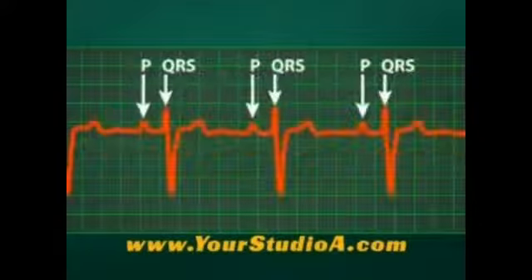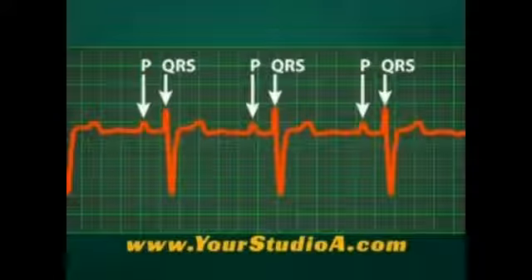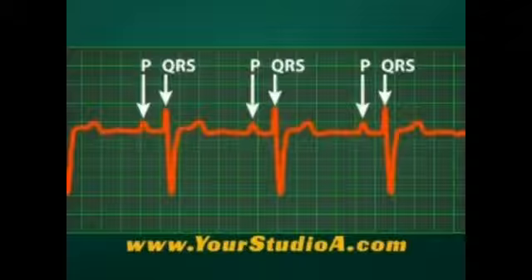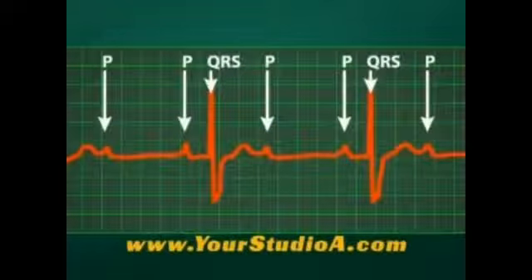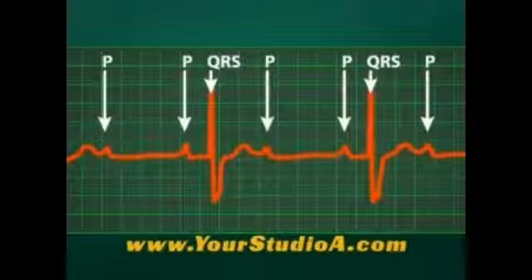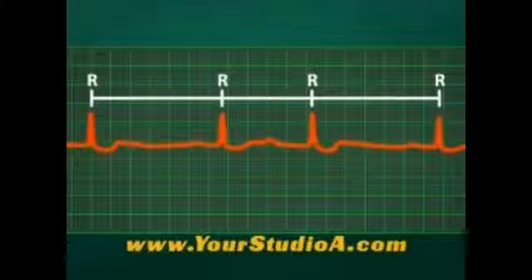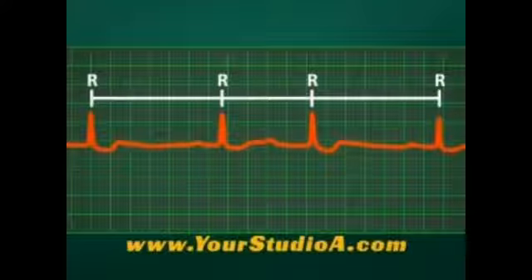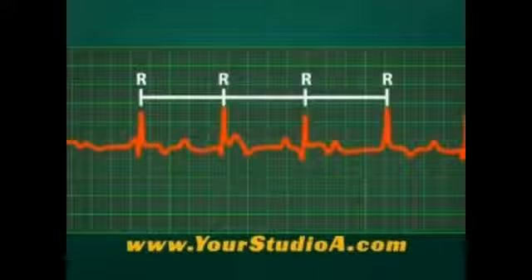If the PR interval is constant, now look at the P to QRS ratio. If there are the same number of P's as QRS's, it's a first-degree block. If there are more P's than QRS's, it's a second-degree type 2. If the PR interval was varying, then look at the R to R interval. If the R to R interval is varying, it's a second-degree type 1. If the R to R is constant, it's a third-degree block.